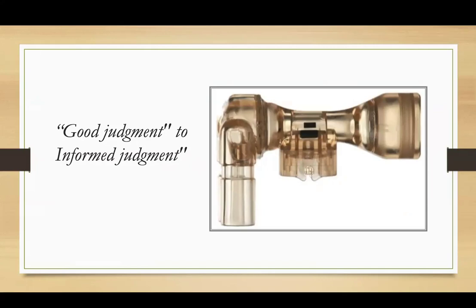So for this, there is something called pulmonary graphics, where you just look at the graphics and you can identify various misadventures, and whether the settings are appropriate or not. But remember, the heart of modern ventilation is a flow sensor. Whether you are using patient-triggered ventilation or you want to know about the patient's condition or the settings, you need a flow sensor which is working.